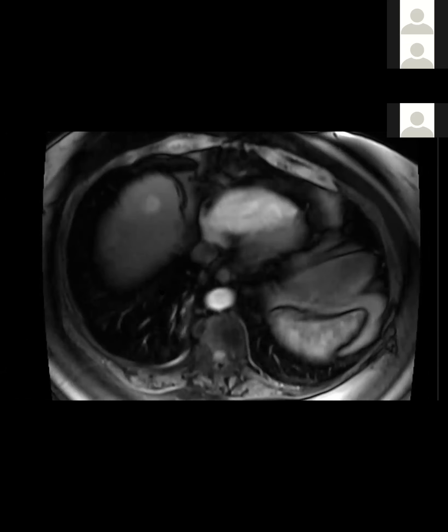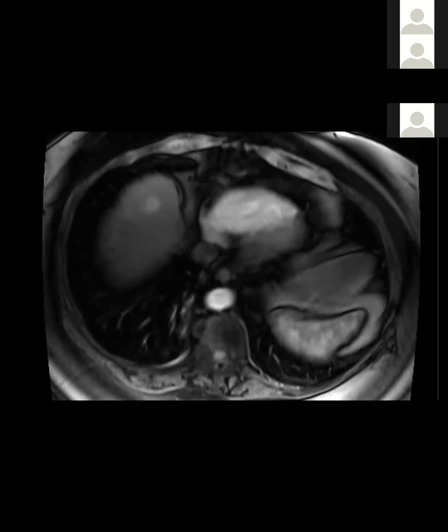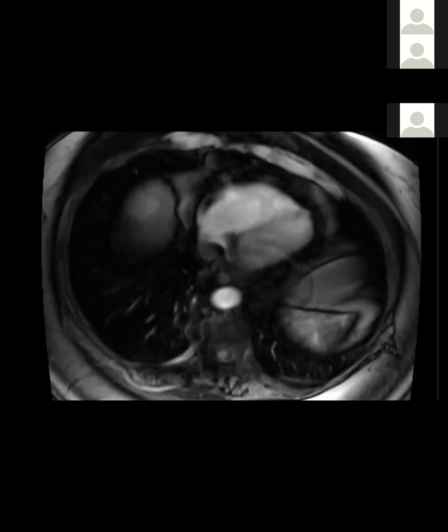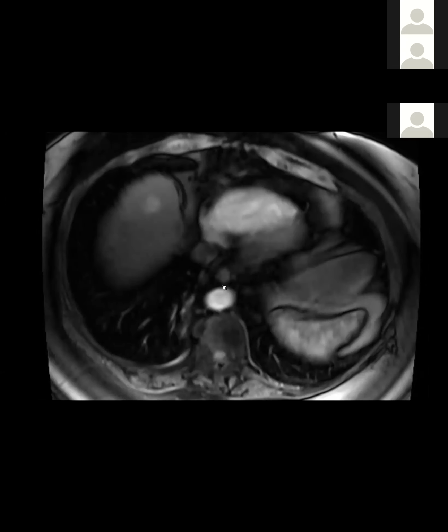I'm trying to be very objective, right? Without knowing what happened to it, would I have raised any concern about it? And I personally don't think so. I think I would have just shrugged my shoulders and said, small hemangioma that just doesn't perfectly fit. Sometimes lesions don't follow what they need to follow.